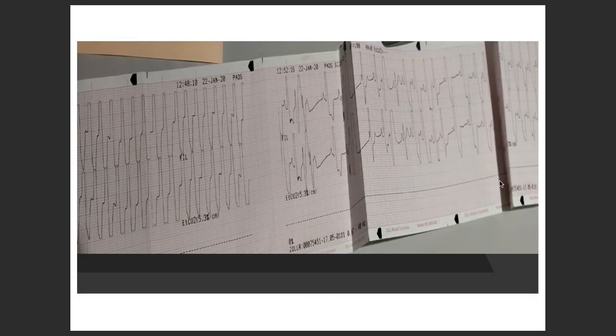Go to the next ECG, which you can see, right? So the wide QRS tachycardia, which was going on over here, we start seeing those sinus beats, right? We can start seeing those P waves there, QRS, T waves. I did some magic. What was done? And I would say a big hint for that is it's a physical maneuver. Good. What I actually did was a Valsalva maneuver.